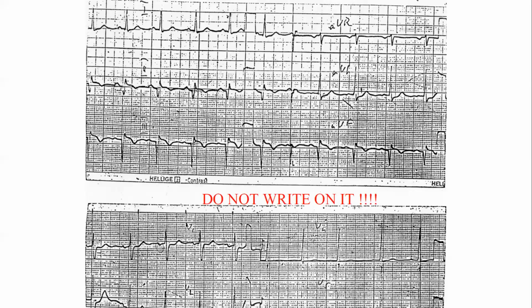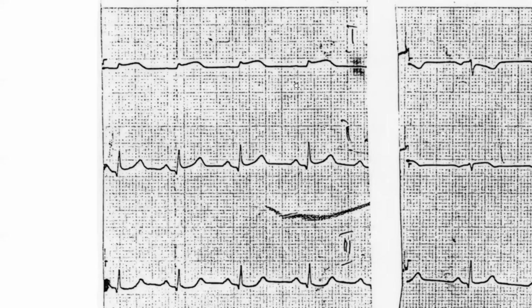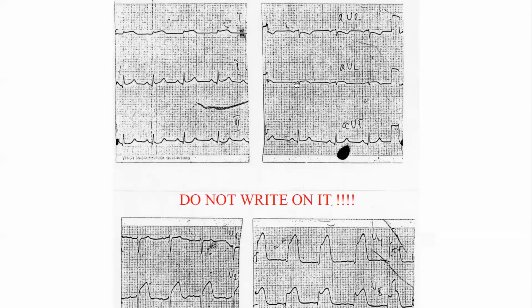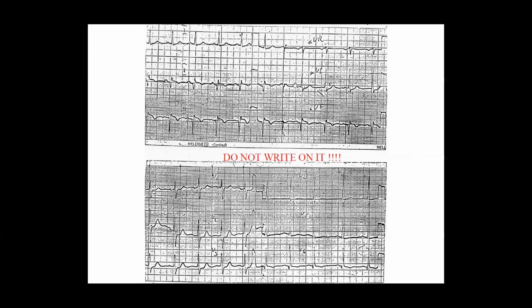If you come here, it's still okay because you have to look from this point to this point. So it's not wide. So this QRS is narrow, all right?